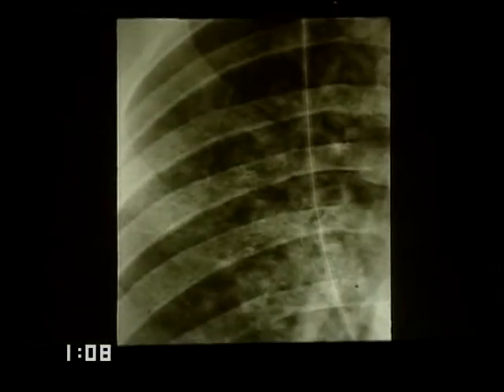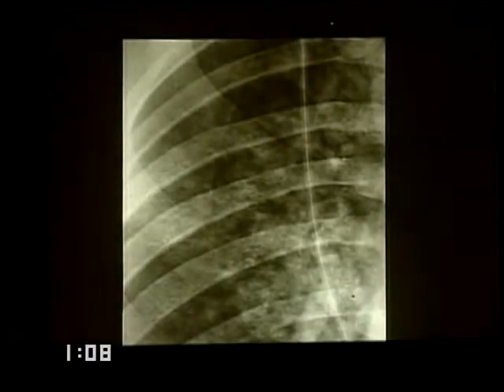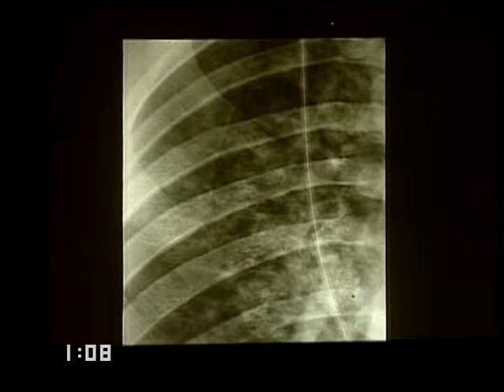A classic example of the airspace nodule is in someone who was prematurely extubated, made a frantic effort to take in a deep breath, profoundly reducing intrathoracic pressure, and sucked water out into the alveoli, and we see these small and very indistinct alveolar nodules. If we had taken an X-ray 15 or 30 minutes later, these would have become more coalescent. One might not have recognized this nodular opacity, which in real life we don't see very often at all.